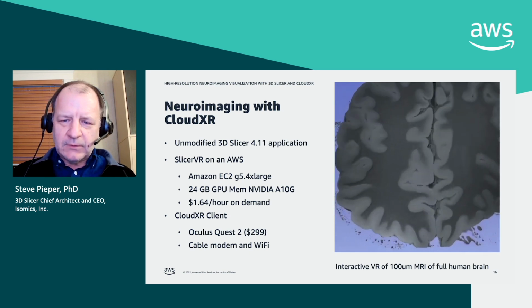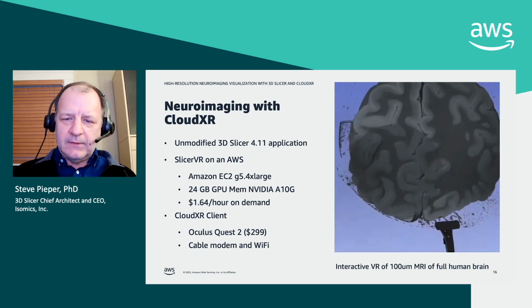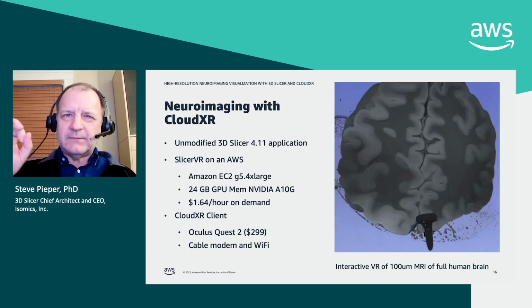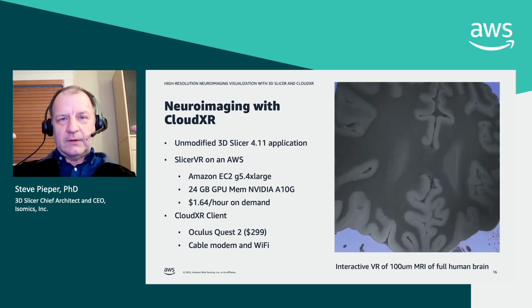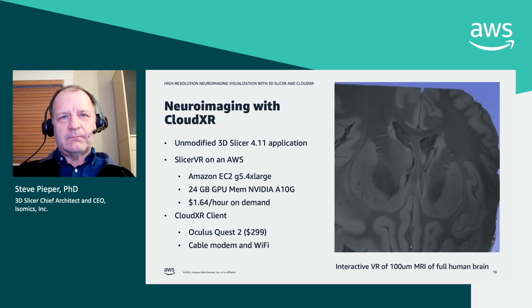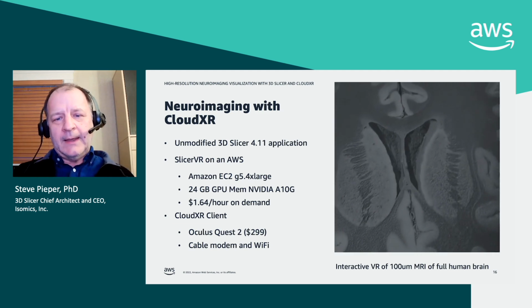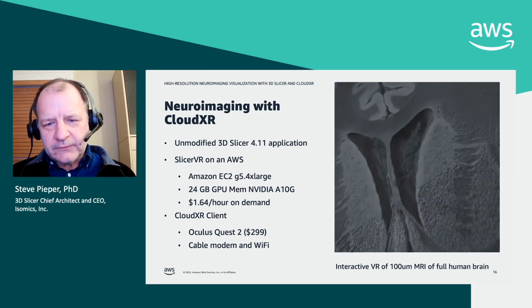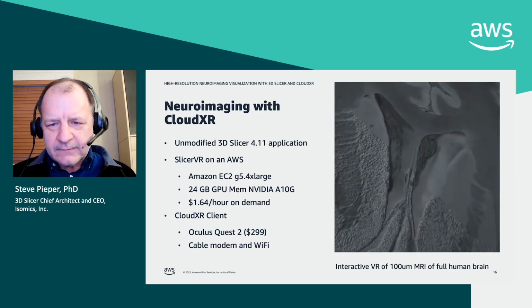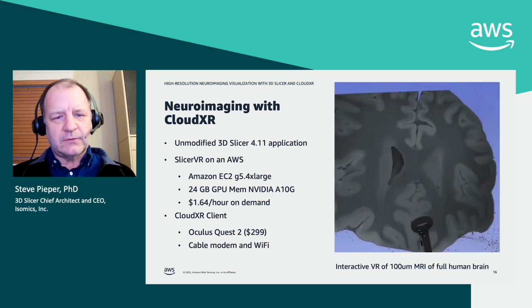One of the things that really impressed me about looking at it this way is that you see the blood vessels in the brain look like tubes. And when you have the brain about this size in front of you, one of those blood vessels looks sort of like an aquarium tubing. It's clearly a tube. It's not just a bright line. And here you can see, looking into the ventricles, quite a bit of detail. That's very, very nice detail about the internal structure of the brain.